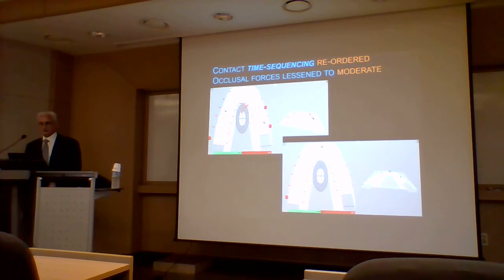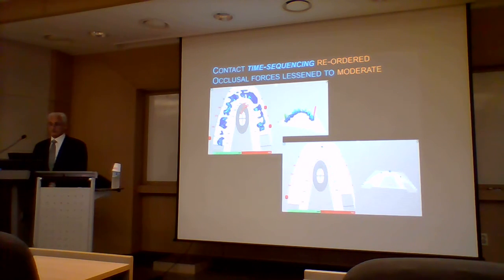So if we compare the two preoperatively, you can see the overload in the anterior. The right implants are very forceful. The left implants are actually, as I said, late and reasonable. But compared to the end result, uniformity anteriorly, no overload. Implants later bilaterally, no overload.